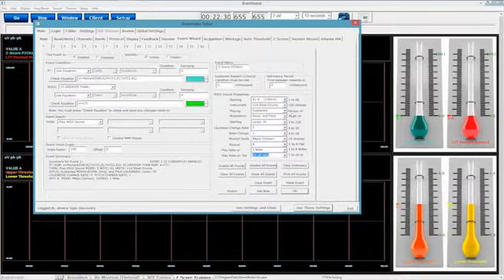So really when it comes down to what you're going to choose right here, you can either A, talk to some other people out there who have some great recommendations on what to play, what gives them good feedback and other things of that, or you can just play around in simulation mode. That's what I usually do, and I think that is a great way to usually start off. As far as the other settings on here, most of these are fairly standard and a pretty good way to go. A loudness rate that's not too loud, you aren't doing too much changing on different things, and the note isn't too high and isn't too low.